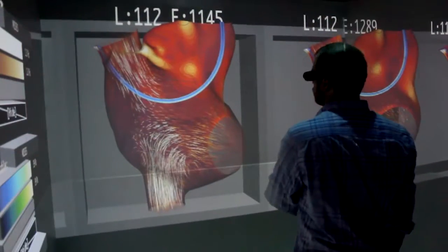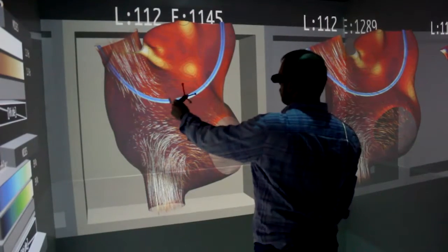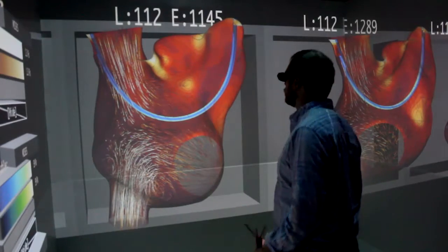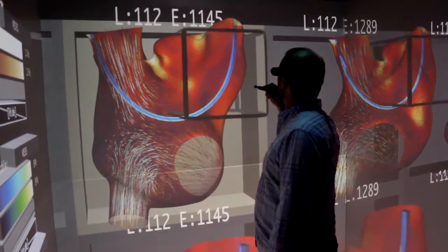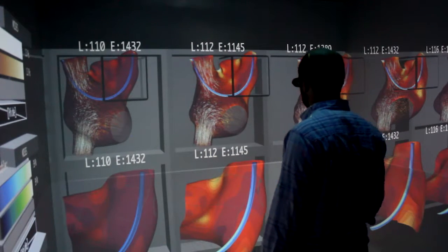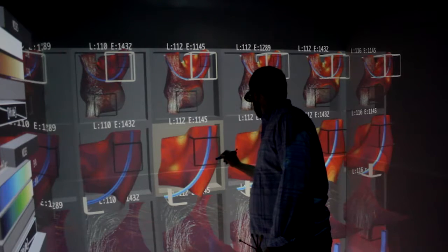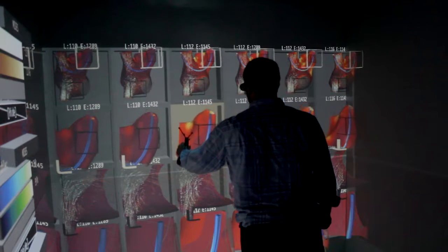The top row of the box is zoomed out to show the entirety of the data. We can grab the visualization and reorient it to see different views. But what is most useful for making comparisons is to zoom into the data, selecting a sub-volume of interest. This adds a new row and automatically recenters the visualization. Additional subvolumes can be added, starting either from the original overview or from an existing subvolume, and each can be adjusted to set up a useful comparison.